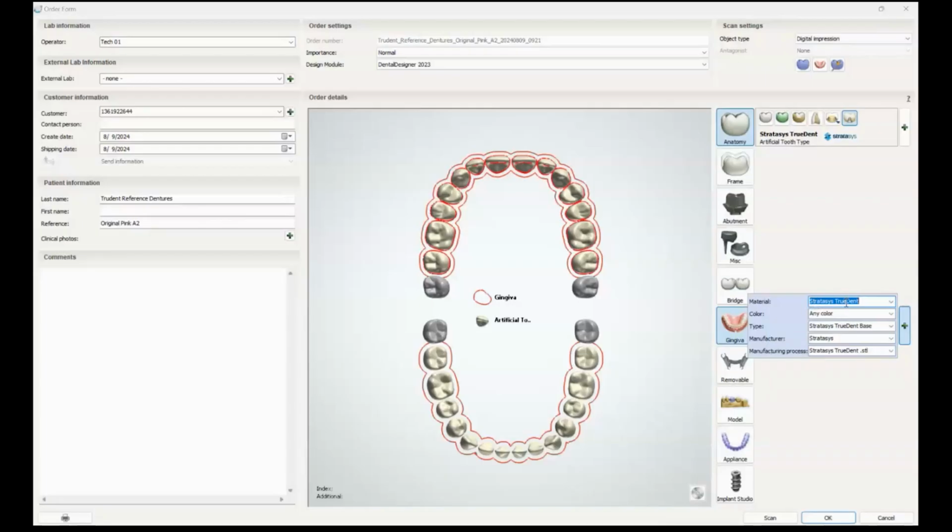The other piece that you'll have to do on here is down at the bottom where it has manufacturing process, depending on what output you want to get from this. So if you want the 3MF file for the color printing, you can do that. You would just select 3MF here. Or if you just want the STLs, that's fine as well. You can select the STL output here. If you choose the model material, it will automatically only give you the STL outputs. It will not give you the 3MF output. So I'll go ahead and choose the 3MF output.